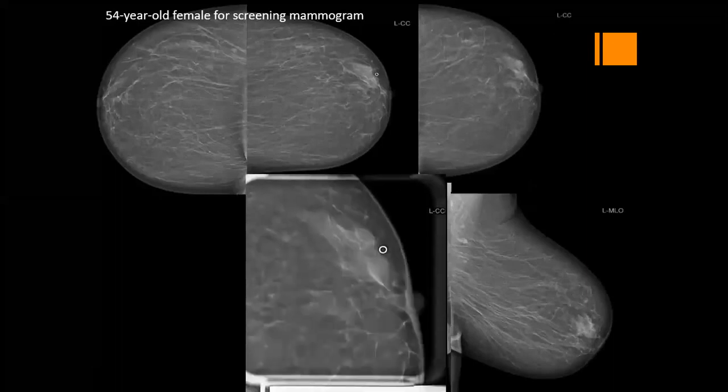It is magnified, it is near to you. But yes, the same density. It doesn't fade away. You see, is there any apparent convexity in the contour? Yes, there is some convexity, and there is subtle surrounding distortion. And look at the nipple and the areolar thickening.